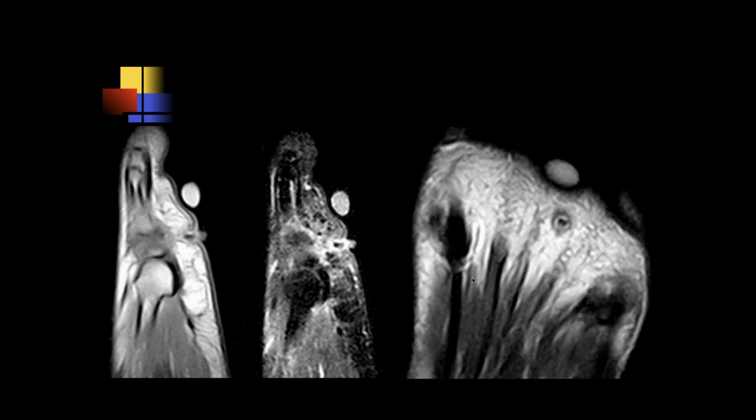Okay, so it looks like we have a soft tissue defect on the plantar aspect of the foot with a sinus tract or something. It looks like there's some signal in there. I don't know if there's a foreign body like the other cases. And that's what it looks like on the axial image. What about the shape? I don't know if that's just volume averaging of that MTP joint.